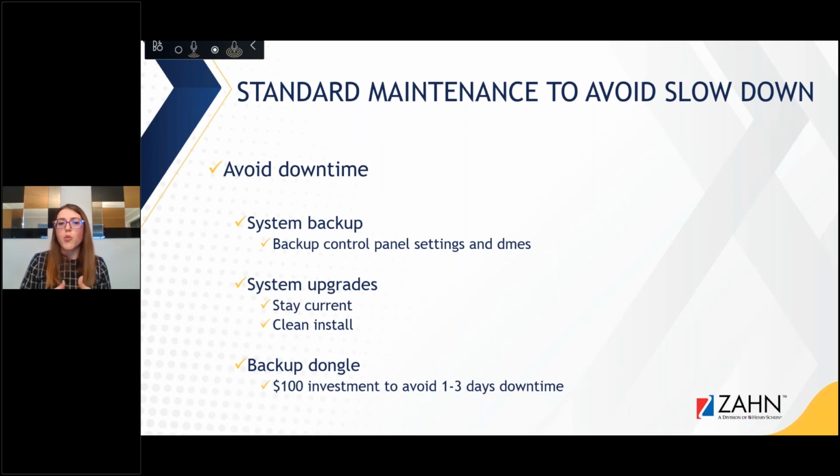Another thing is when you're importing, it always gives you the option to import all or some, just like I showed you where you have the option to export all or some. Only import what you need when it comes to implant libraries or material libraries so that you don't overload the system. But a clean install not only will give you a fresh start, a clean slate, you only import the implant libraries and the material libraries that you need, but also all of these libraries get updated.